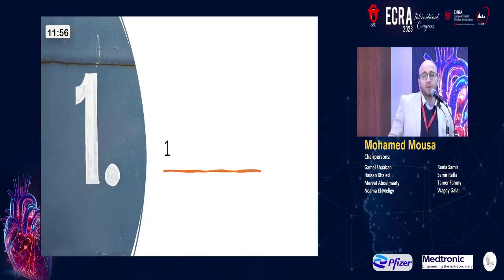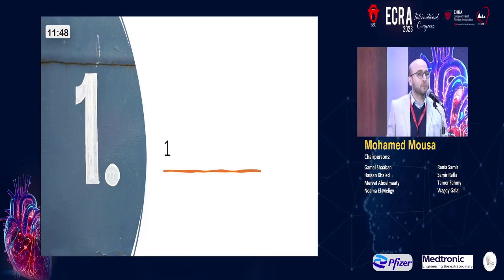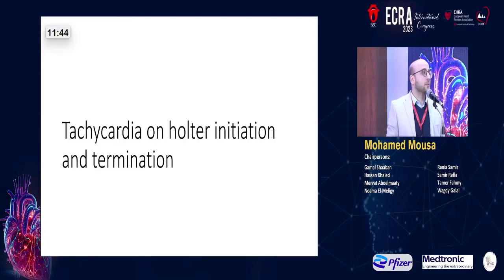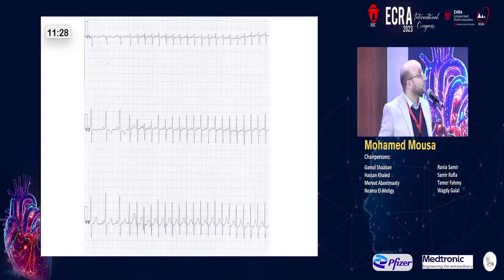بسم الله الرحمن الرحيم. Actually, it was better to be an interactive session, but I will show some unusual ECGs in SVT. Let's start with the most talented one, the Holter. Holter interpretation needs to see when the tachycardia begins and how it ends. You have to get any PVCs, PACs that interrupt the tachycardia and how the tachycardia interacts with it, as we see in this strip.